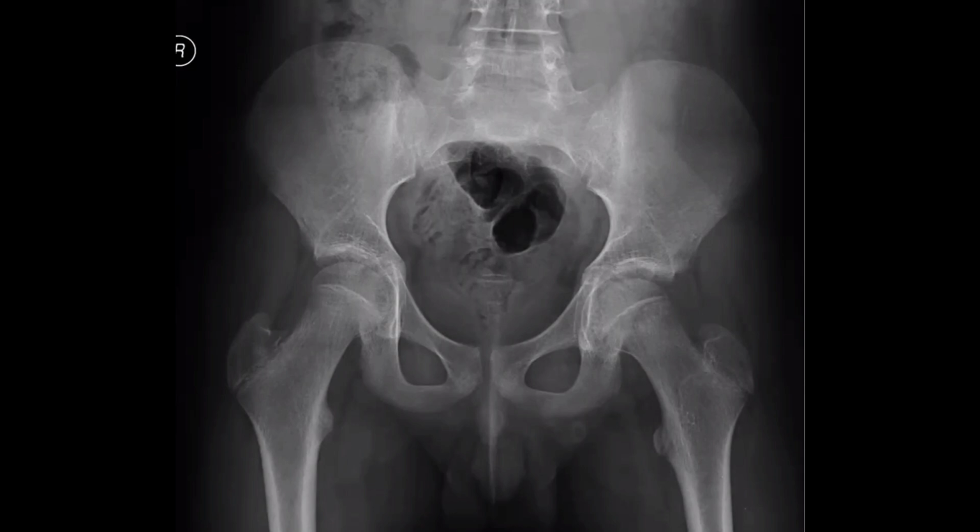No evidence of any avulsion. I think this is the adolescent age group. Do you agree? Sir, just fused epiphyses, but a few of them are not fused, so it is an immature skeleton. Yes. I would like to know the history, if there is any history of bilateral hip pain. Yes, hip pain.